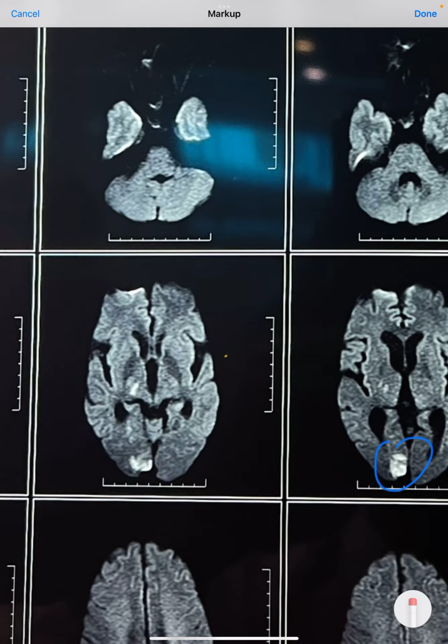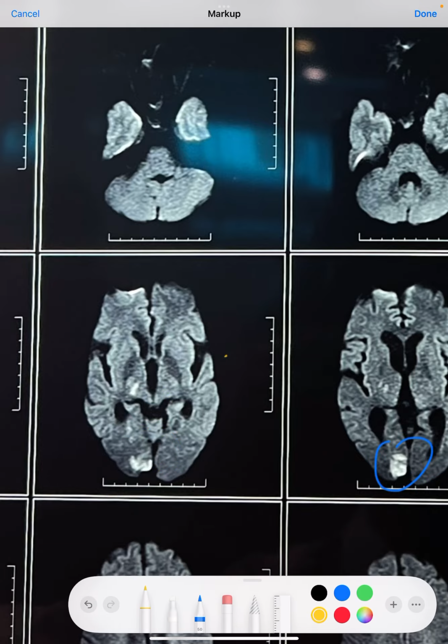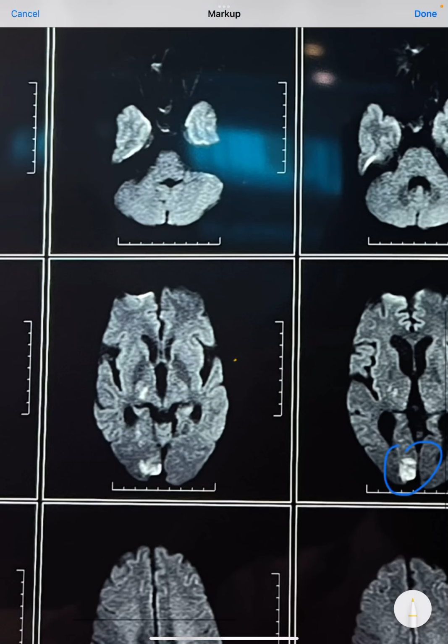To recognize thalamus, this is one of the best slices. We can see these are the two ventricles. This is the first ventricle, this is the second ventricle. This small almond shaped structure is the caudate, and exactly backside of it, this portion is all thalamus.